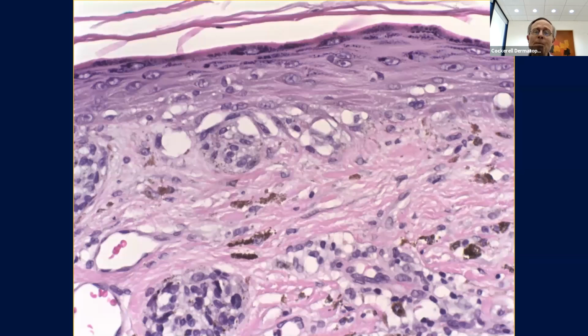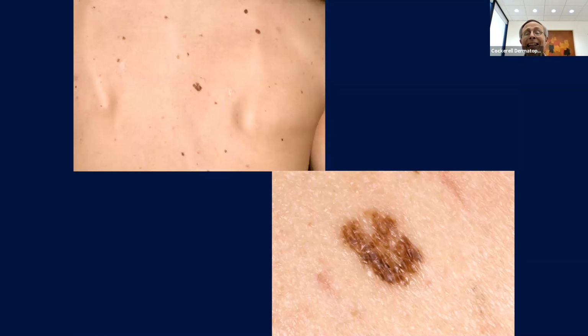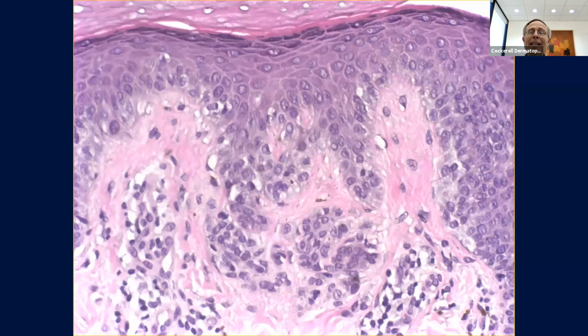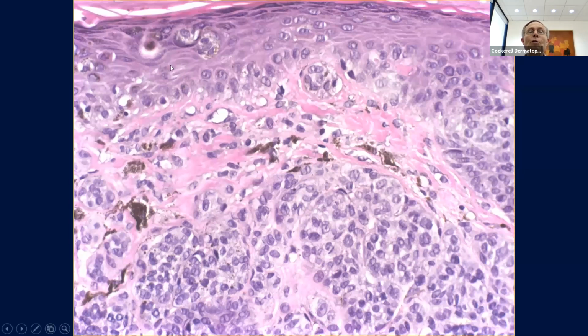And so we used to call these special site nevi, but the more we look at these, the more you realize just every part of the body has got some special site phenomena in them. This is on the acral skin. And here we often get pagetoid spread throughout the epidermis. This was actually referred to as a maniac nevus a few years ago by Dr.